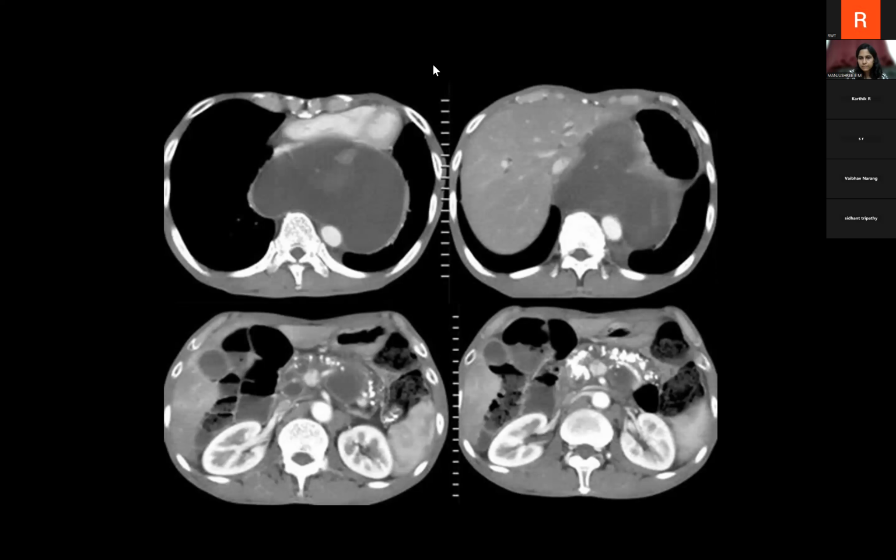Time is up. Sohan, many of you have answered, but Sohan has answered it completely. It's mediastinal pseudocyst with chronic calcific pancreatitis. This is pseudocyst because here we can see that there is a cystic lesion in the posterior mediastinum, and when we see the abdomen sections, here we can see that there is chronic calcific pancreatitis, also pancreatic pseudocyst. So when we correlate both these findings, we come to a conclusion that this is a mediastinal pseudocyst with the background of chronic calcific pancreatitis.